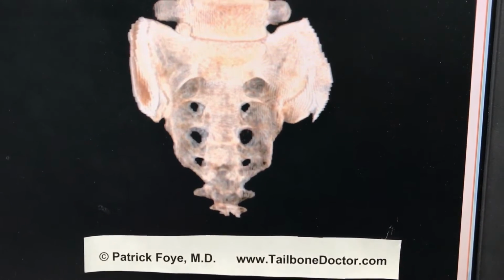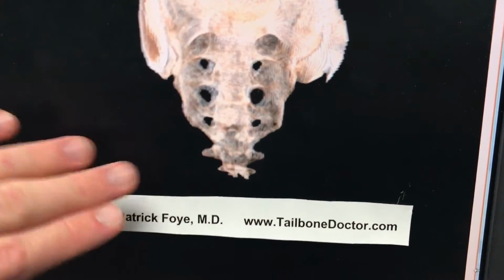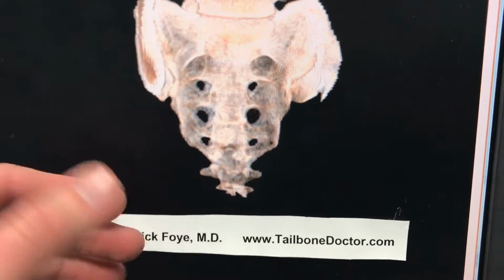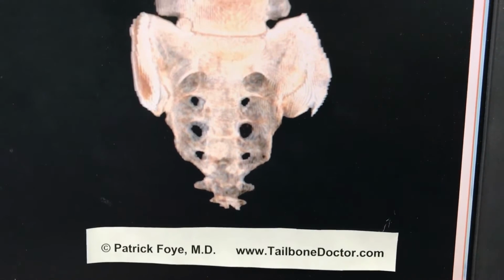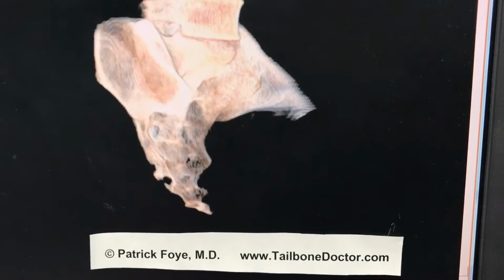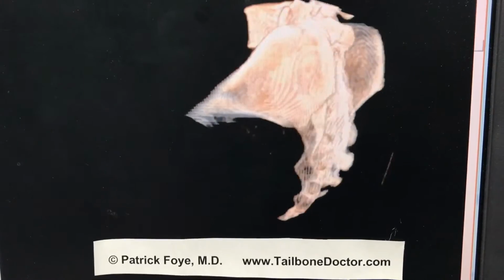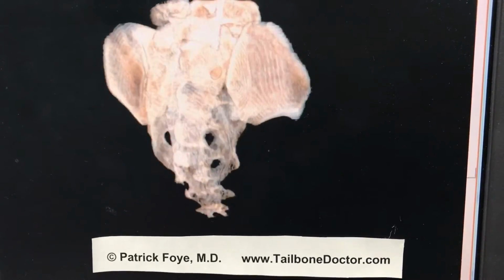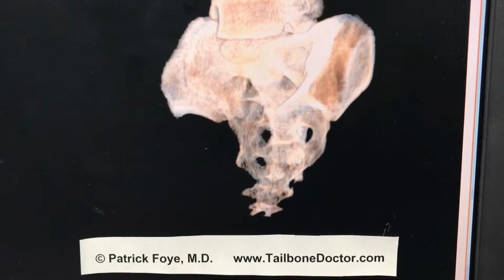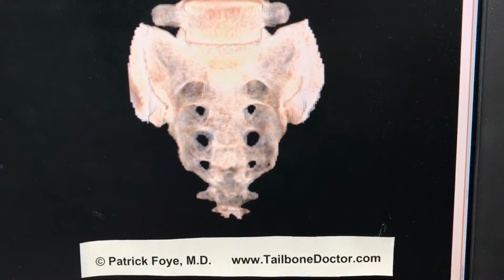So rather than just having a static image, like one image or one slice, all of those slices are put together in a digital way on the computer, so that the clinician or physician can basically rotate the image in multiple directions. So I can go back and forth, and that allows me to look from many different angles at a given area if there's an area of interest or concern on the patient's imaging studies.